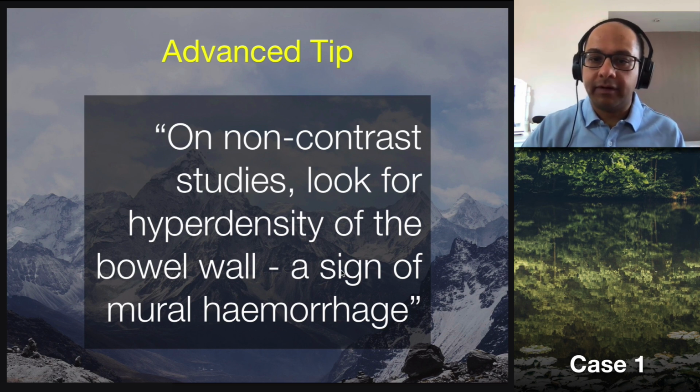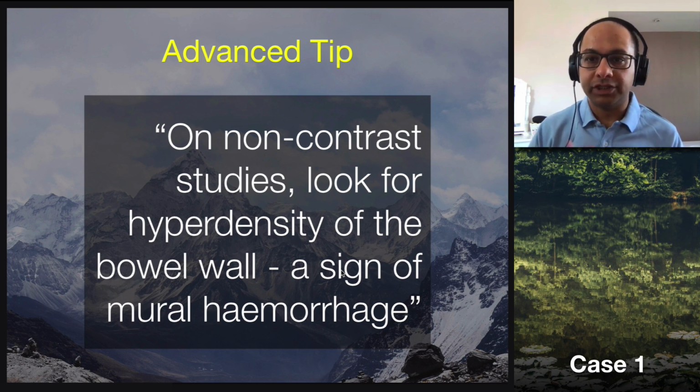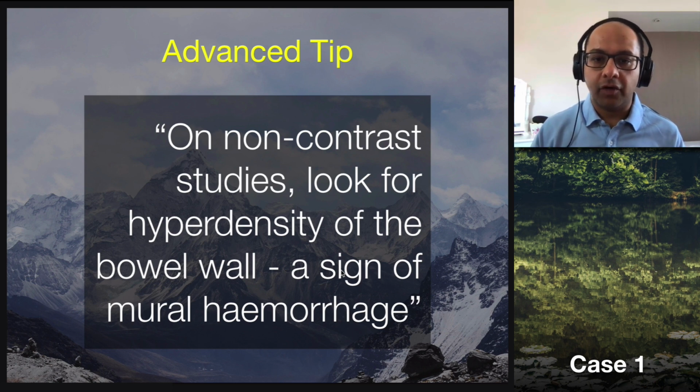really played up as a very important tool in looking at bowel ischemia, because you can generate a virtual non-contrast image that will tell you what the actual density of the bowel wall is. And then with the contrast on top, you can actually assess what the enhancement is, what the additional increase in density is with the contrast. And so that is said to increase the confidence of readers in detecting bowel ischemia.